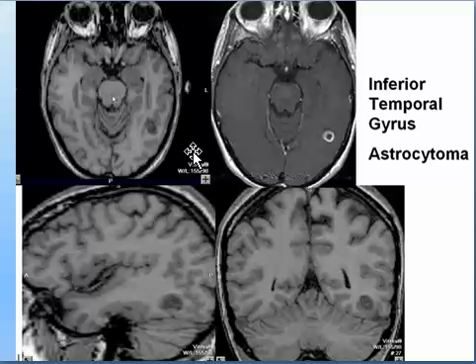And in axial views we have the appearance that it is seen in the posterior opercular region, anterior, middle, and posterior opercular region.